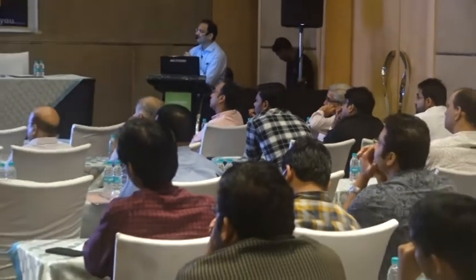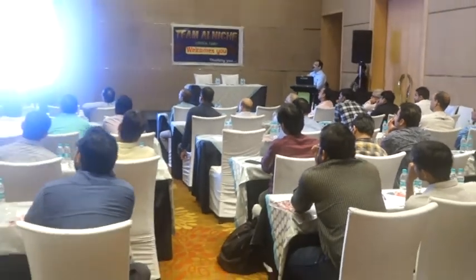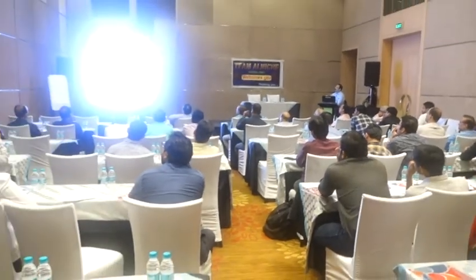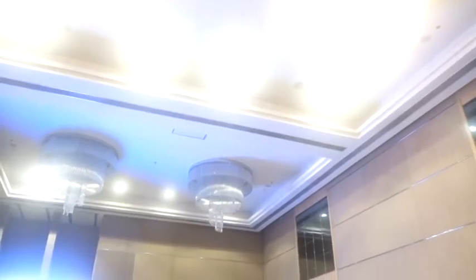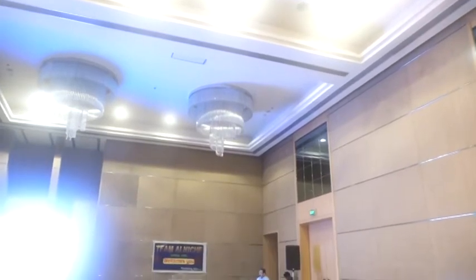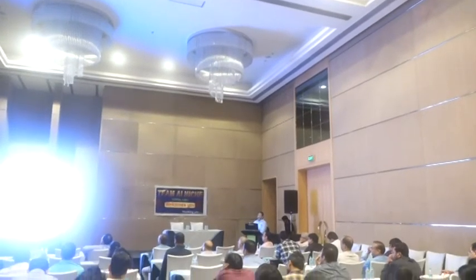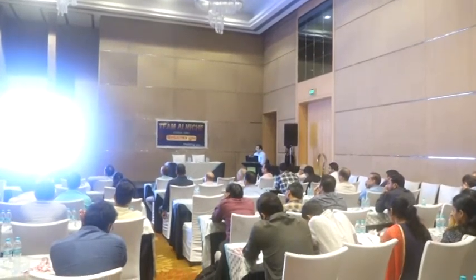In this window, the lungs are clearly visible and the soft tissues are less visible. And this is a soft tissue window, where you will have the soft tissues more visible, and this is a bony window. You will be looking at lungs, which have air, and airway, which has air. A for air, B for bone, C for cardiac and great vessels, D for digestive, E for extra, S for soft tissues.